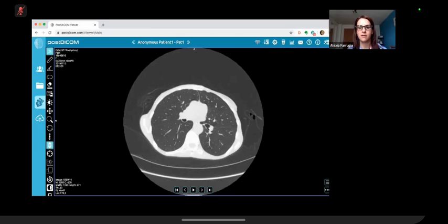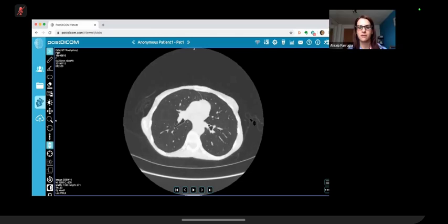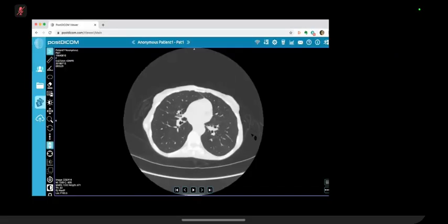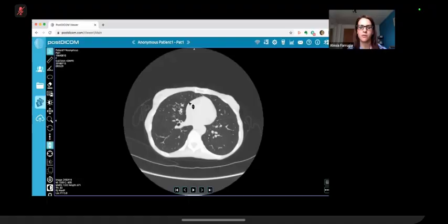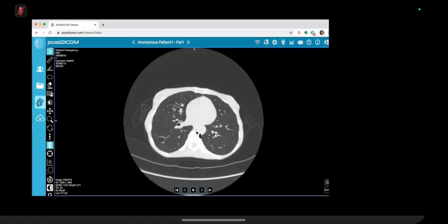And then if you go down, what's the pattern? So having a look, down to the middle lobe. So if you look here, focus on the middle lobe. Yeah. So there's mild bronchial wall dilatation, and there's some nodularity adjacent to it with bronchial wall thickening.